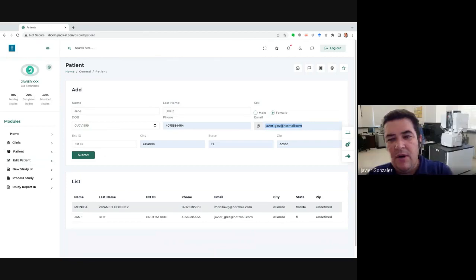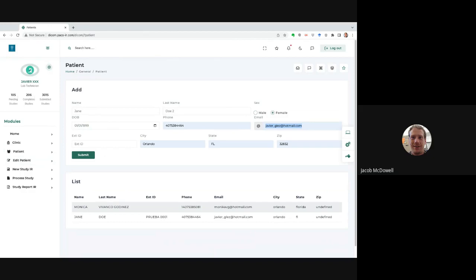After you do all the study and upload the files, you press a button and you convert everything to DICOM, and it gives you the report in PDF for the patient and whoever wants to read it. There's also a QR barcode that you can use to download the DICOM information. So yeah, this would go to DICOM and then the interpreter.